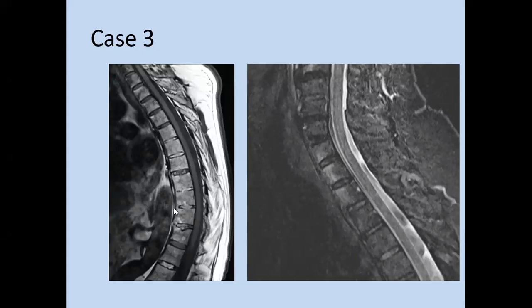And on the T1, we can see these syndesmophytes here. We can see the squaring of the vertebra. We can see the fatty infiltration in the corner of the vertebrae again here, and that all is in keeping with ankylosing spondylitis. You talked about Andersson lesion. We will leave it for now because we will cover it in the next slides.